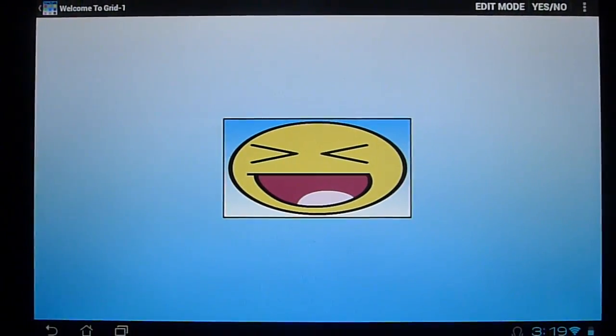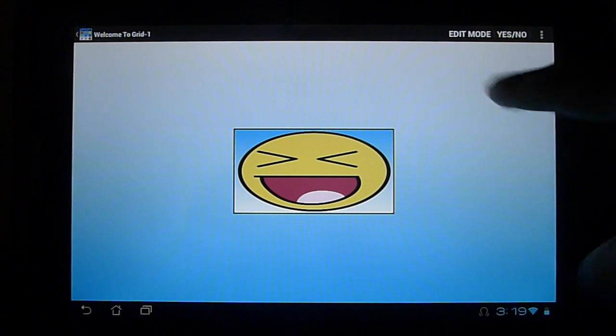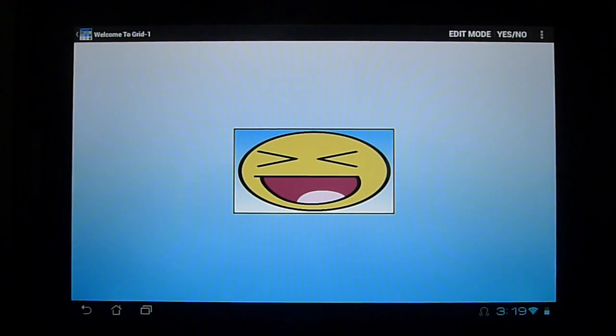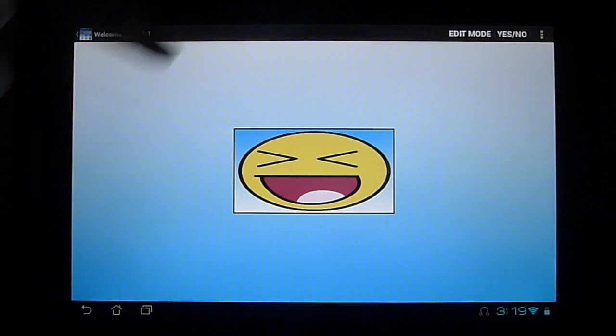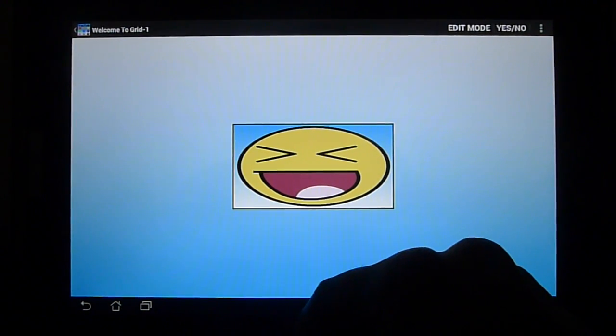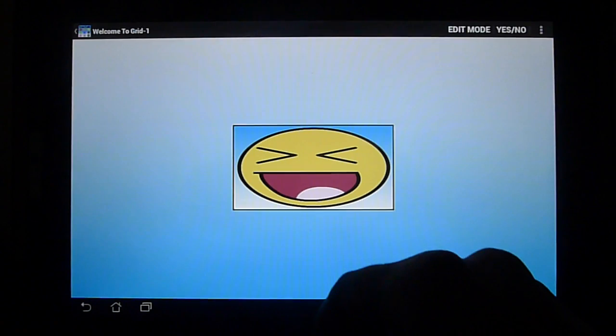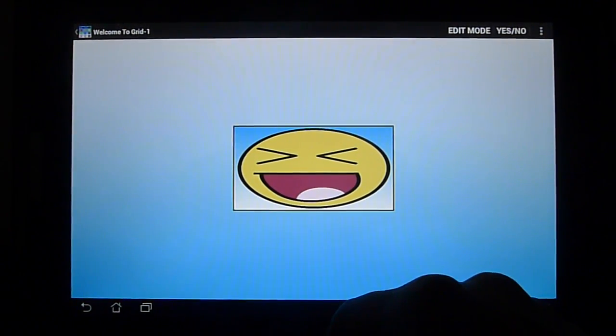And you can tell that you are back in speech mode because the toggle above says edit, so you would have to click to go into edit, so it's in speech mode. And also the select tiles are not visible. The tiles that aren't used are automatically hidden. So if we click on our tile now, "I like to smile." It'll output whatever you had as the text. "I like to smile."